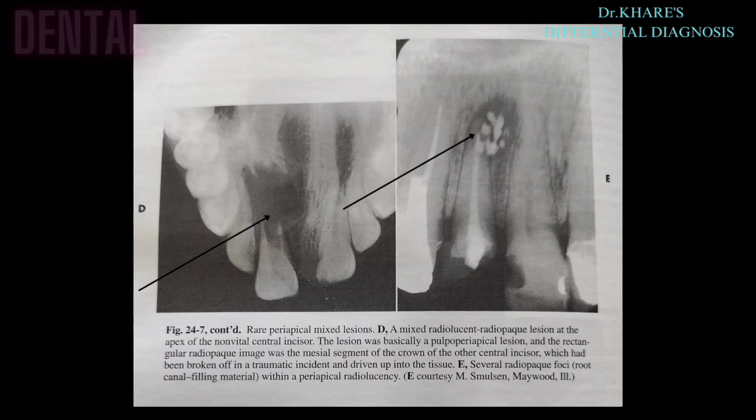Some more rare periapical mixed lesions, where radiograph D is a mixed radiolucent and radiopaque lesion at the apex of the non-vital central incisor.